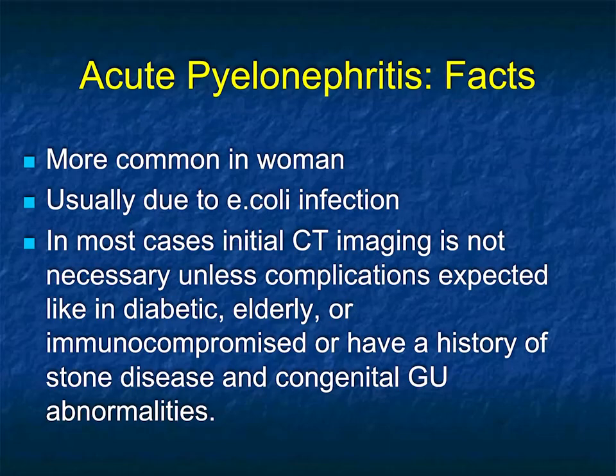In terms of non-contrast scans only, well, the issue is you might see pyelo suggested because one kidney looks larger, or there's perirenal stranding, or the kidney looks edematous.